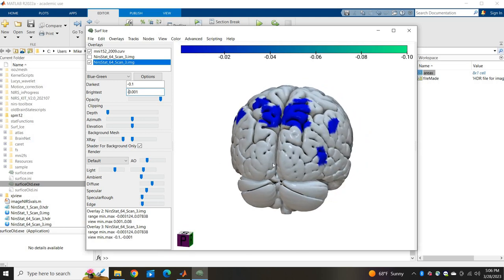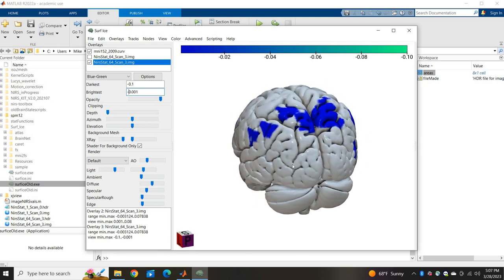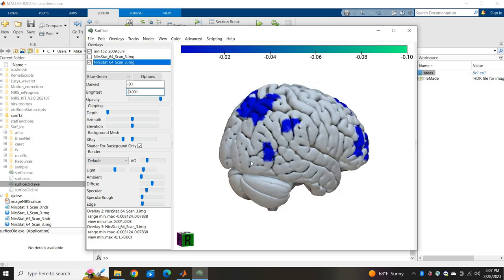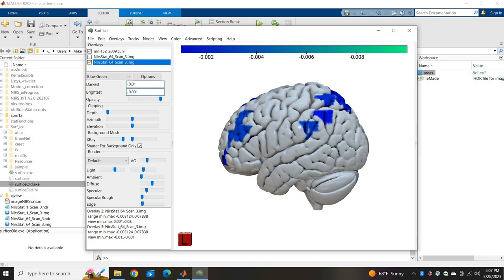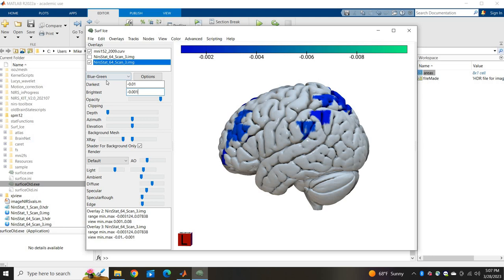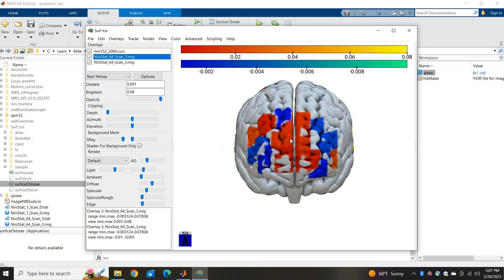If we were seeing any green, those would be the stronger correlations, so it's pretty weak. Negative correlations. I could also make this a little bit more specific, add that 0. It's still pretty darn weak. Anywho, we can add back on our positive. All right, there we go.